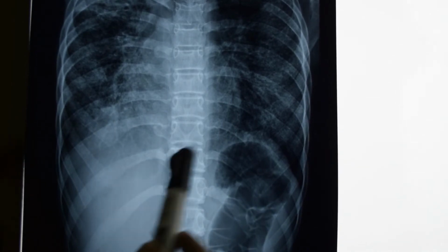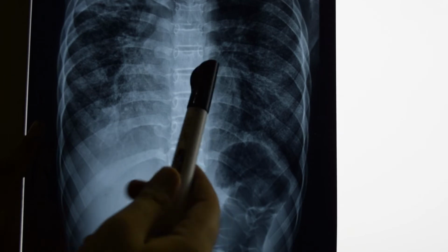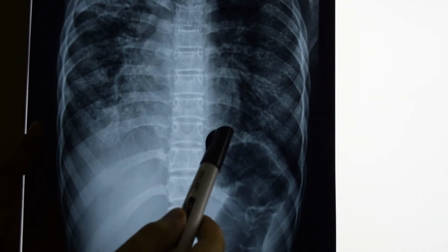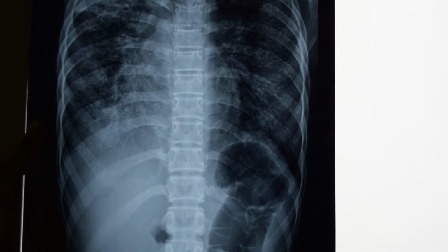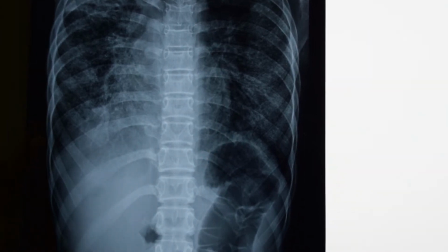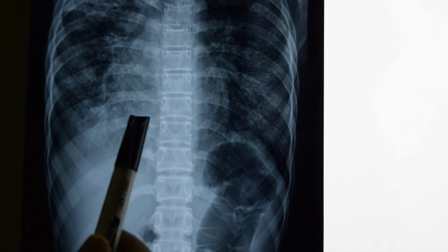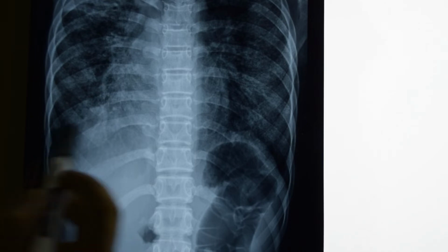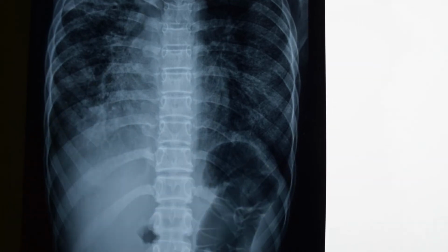and if we can see on this X-ray the cardiac shadows, the left cardiac shadow is quite remarkably identified. However, the right shadow is a bit difficult to identify or mark over its border. Both lungs are having symmetrically arranged nodules in them, small pellet size. And what can be the diagnosis over it?